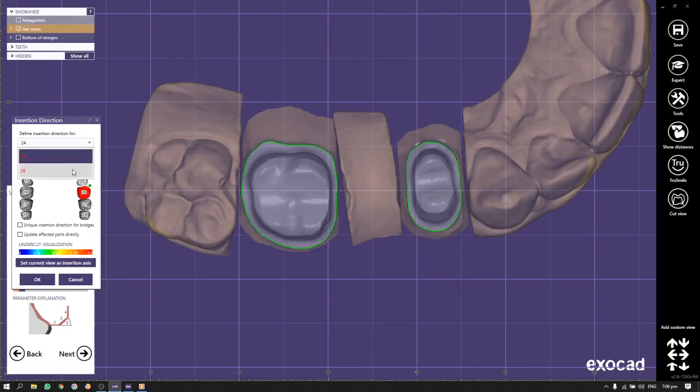In the upper part, we can go here with a subgroup. See, for example, the three bridges. For example, first bridge 24 to 26. The second bridge would be, for example, between 12 and 22. Here I have to go in the list to the tooth 22 and connect it with the tooth 12, so we can move it in groups.